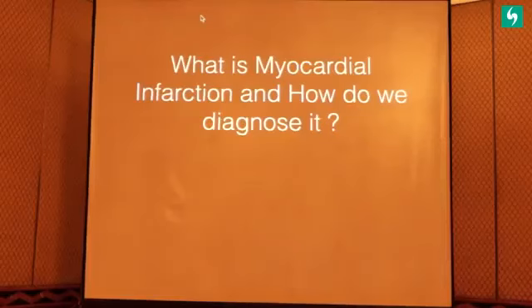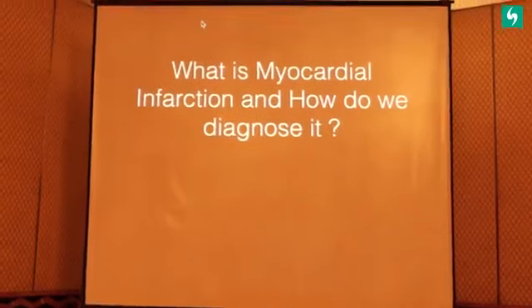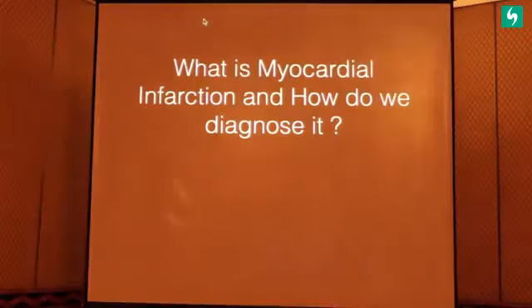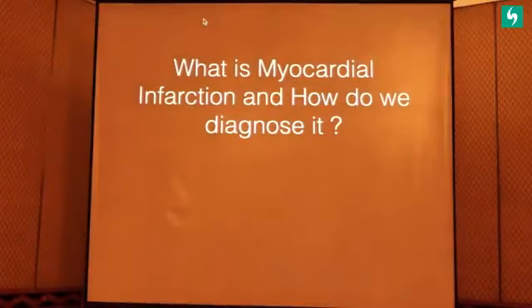So I'm going to show you something not very unusual, something which we see in daily practice. So I'm going to pick up some cases and show you. And ECG is such a thing that each one of us wants to learn, wants to see, and I'm going to use that as the basis of how to diagnose complex problems. So one problem that you see is acute coronary syndrome, myocardial infarction. And there the ECG is extremely relevant.